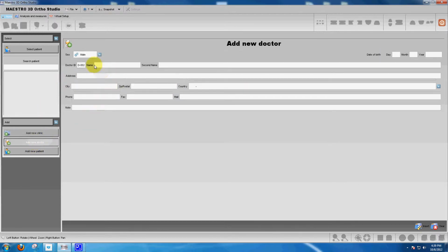Let's enter a few new doctors. So let's make it Doc A, insert. Let's enter a Doc B, and Doc C, and again to make a future point, a Not So Good Doc as a part of our record.